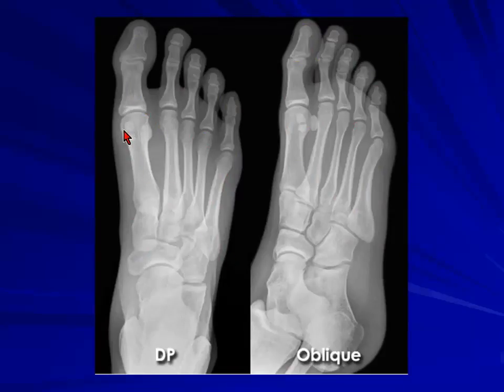So again, these are the sesamoid, which are very important in the feet. They can be inflamed, they can fracture, so it is very important. If you see uptake, you just don't disregard it, or say this is a sesamoid bone, and you just ignore it. You have to look at it and see whether there is a fracture, whether there is inflammation. Sometimes there are two or there can be three. So this is not a fracture, these are two. Why is this not a fracture? Because if you go on to CT, you see a well demarcated area with sclerosis. If you've got sclerosis, then you are safe that this is not a fracture, it is probably two separate bones.